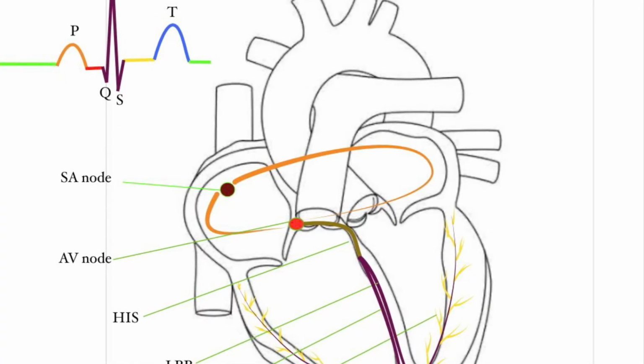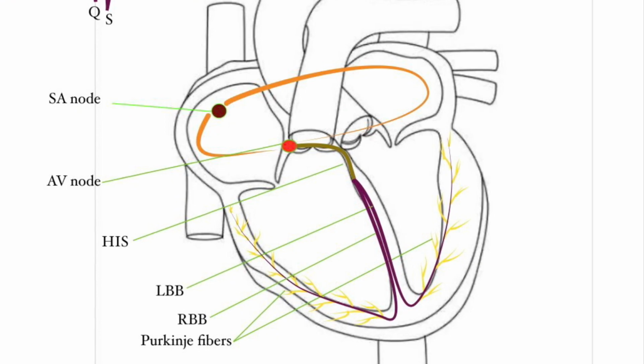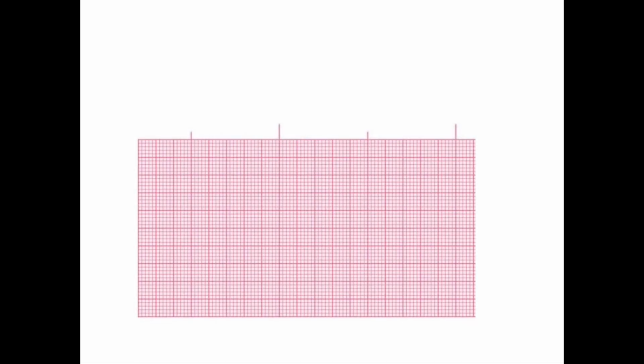In the last session, we learned about the components of ECG. If you have not seen it, please watch it for your better understanding. For this session, let's learn about intervals and segments of ECG. Before that, let's know a few things about ECG paper.